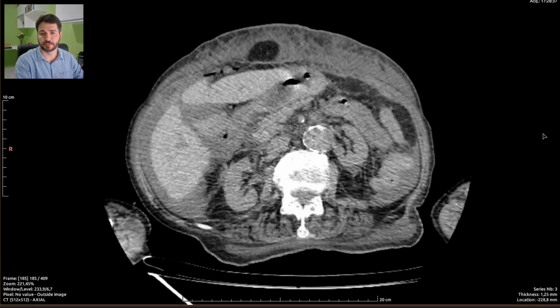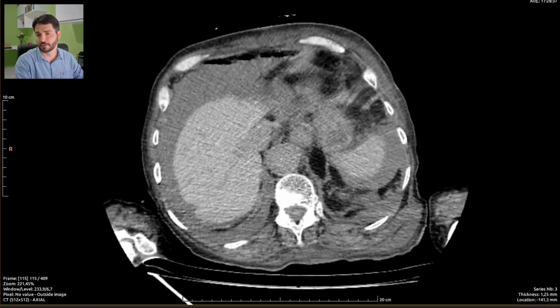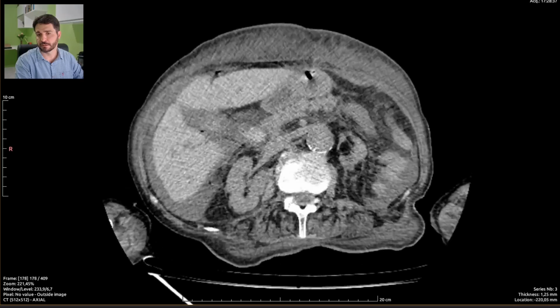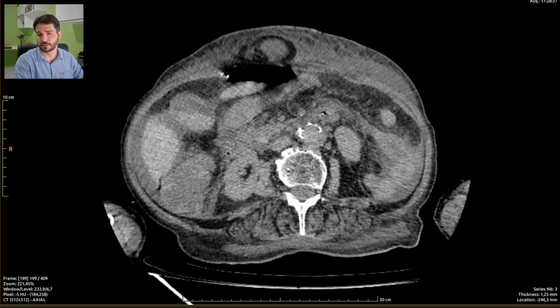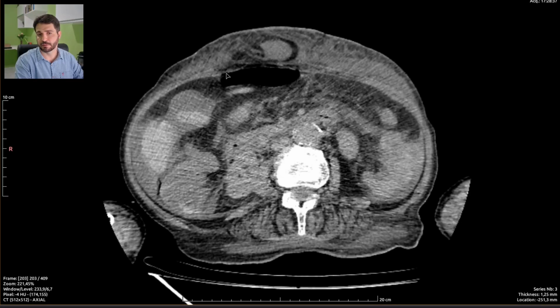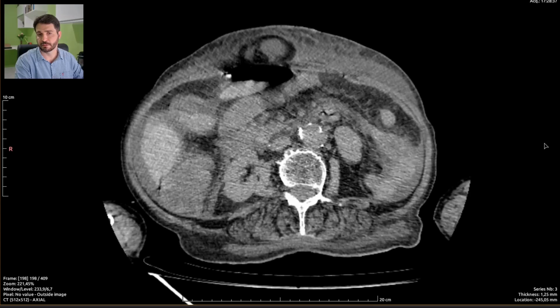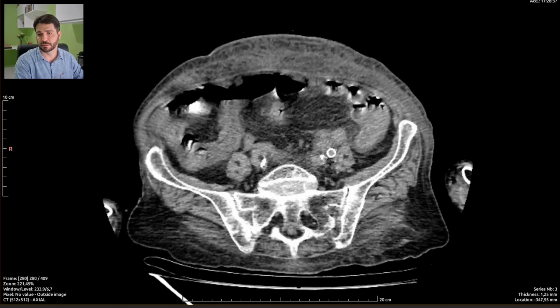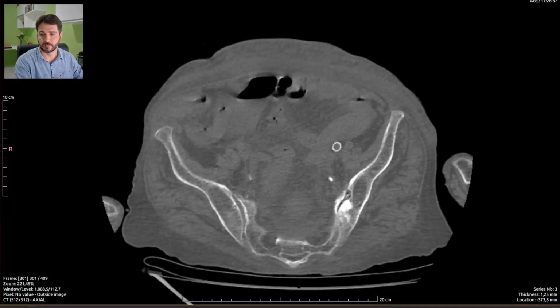pneumoperitoneum. There should be some kind of visceral rupture of the digestive tract, maybe the stomach or the duodenal arcs, or even this loop of ileum right here, or jejunal, which seems way too close to this ventral herniation. Maybe there is some kind of perforation somewhere, we can't really tell.